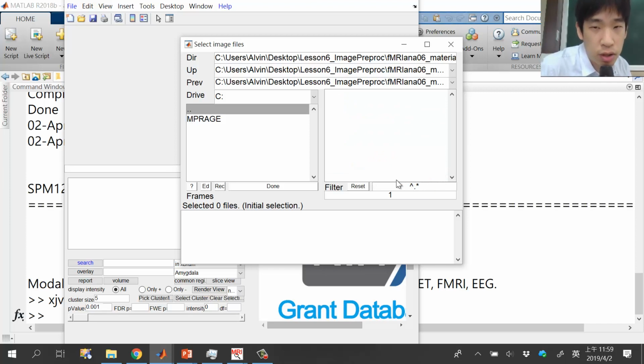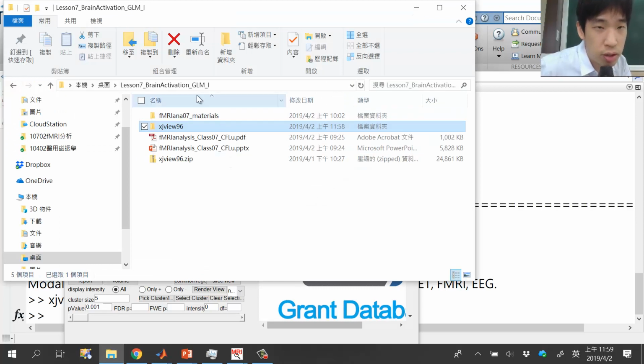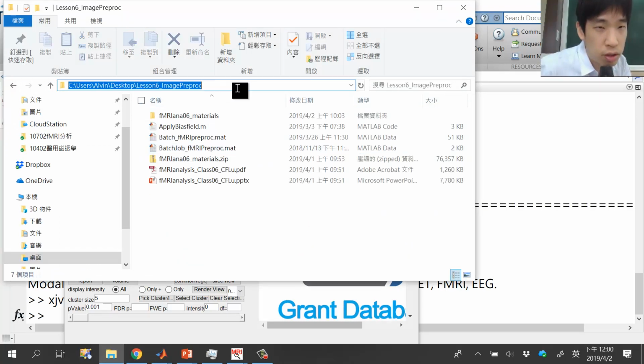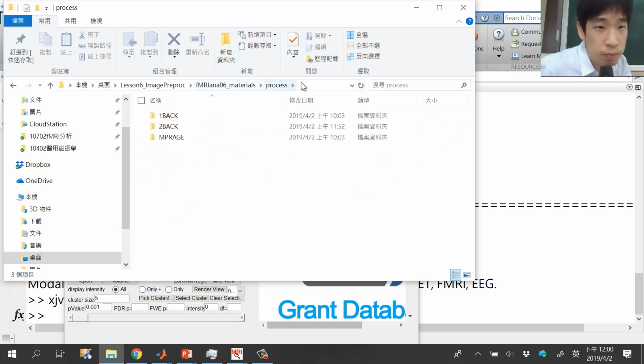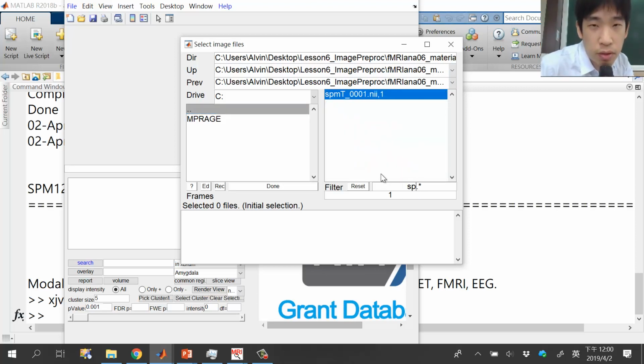Sorry. Oh, why? I didn't see my result. Oh, no, this is not the right folder. My data folder is actually located right here. Okay, let me use this one. This is the right one. I didn't see SPM. Oh yeah, I do see that. Okay, this one. You can find there's a file called SPMT with an uppercase T. That means this is a T contrast. If you may recall, this is a T contrast. And 001. Okay, I focus on the first condition, right?